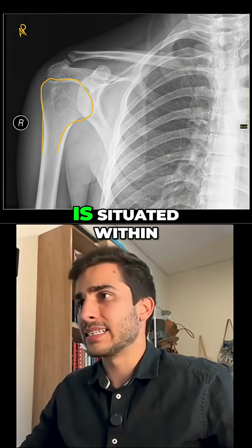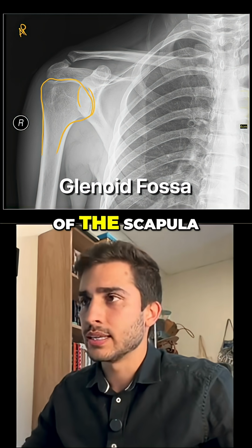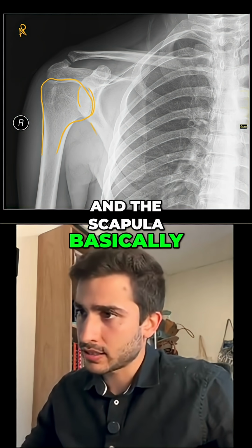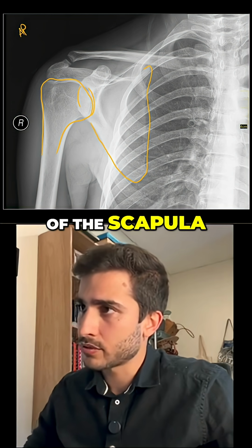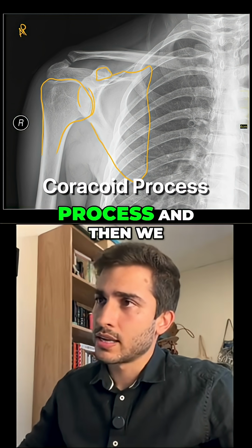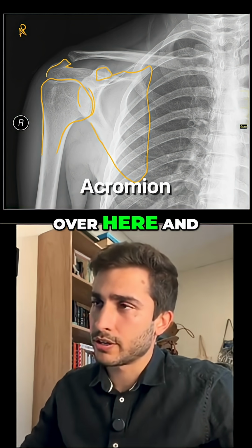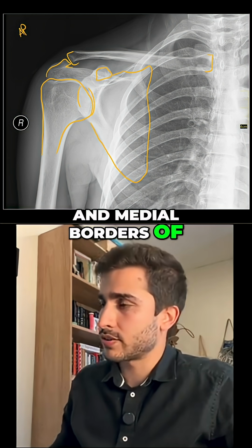The humeral head is situated within the glenoid fossa, which is part of the scapula. And the scapula basically goes down over here, the medial border of the scapula coming down, comes in over here. We have the coracoid process, and then we have the acromion over here. And then we have the clavicle, so we have the lateral and medial borders of the clavicle.